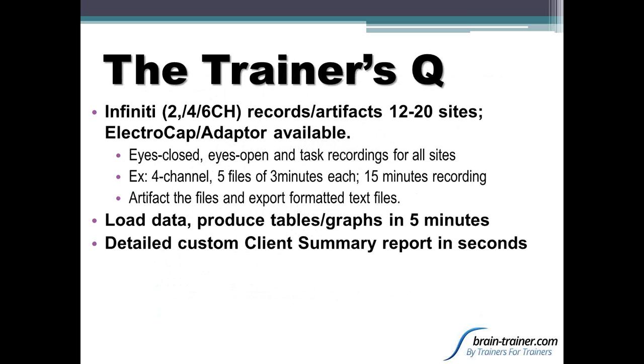So if you're using a 2, 4, or 6 channel Infinity, you can record and artifact the sites. We can, as I said before, between 12 and 20, ideally 20. There is an adapter available that can be used with the Infinity for the electro cap, which speeds things up, allows you to put the cap on one time, prep all the sites at one time.